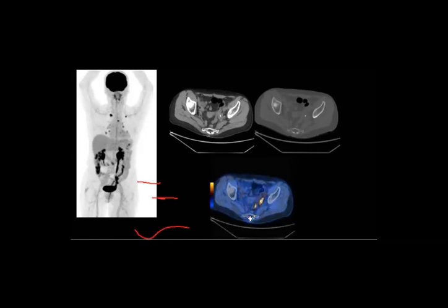And in the osseous bone, you can see in the left sacrum here, there is another lesion. If I told you that this patient already has rectal cancer and he did like resection for this rectal cancer, but now he developed this foci in the lung, and this is in the left sacrum. So what would be your differentiation?